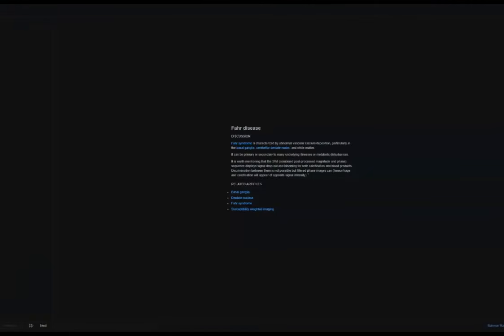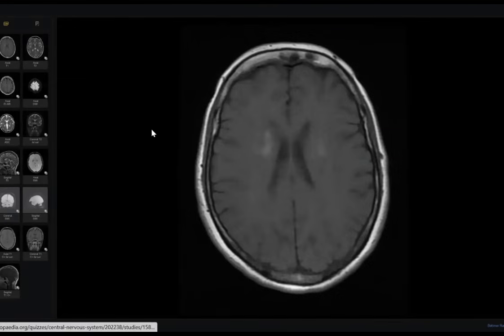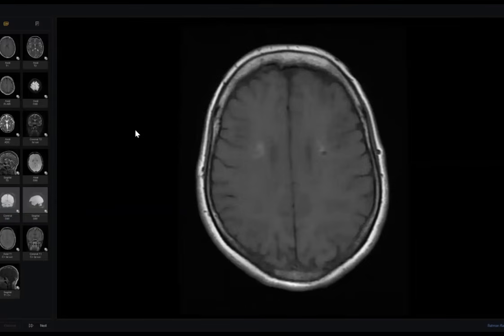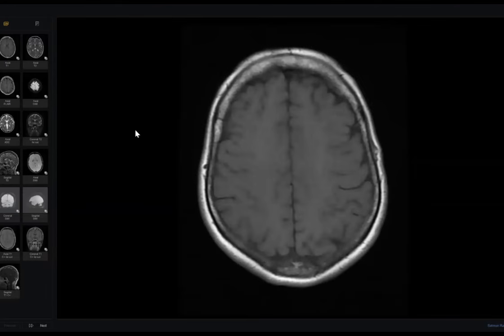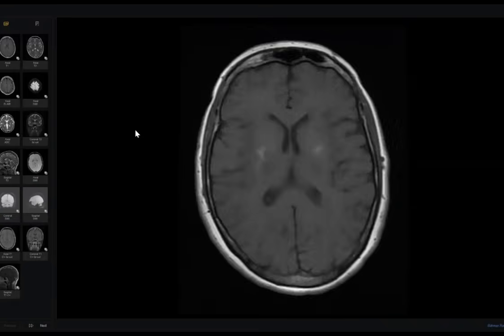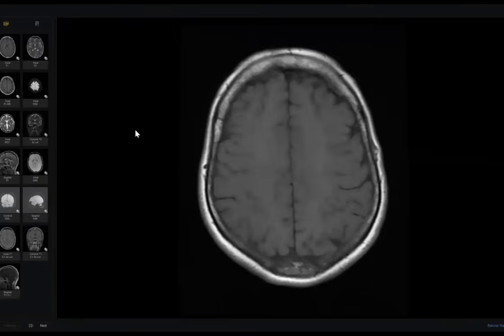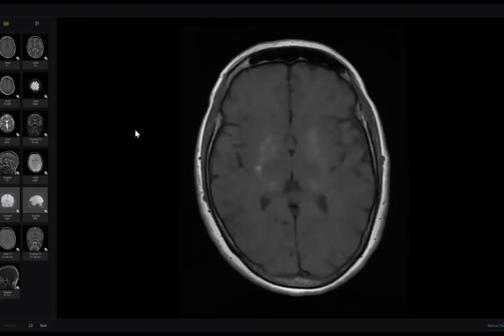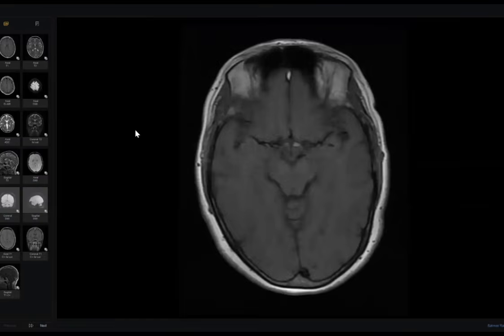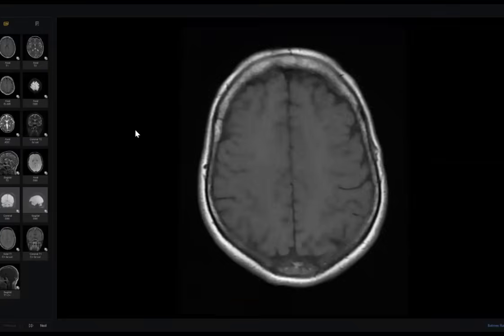What happened here? The examiner may play with you and try to make you doubt, and that is normal and acceptable. What happens if you doubt your answer? Don't doubt. Why? Because this is uncommon information for most of us, that calcium can be high in T1 if it is immature calcium. Immature calcium can be high in T1, like this one.